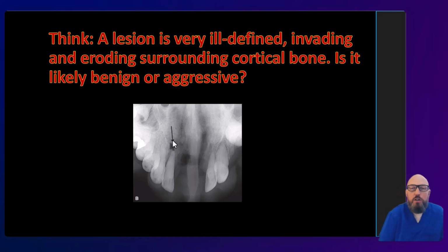And so that covers our size, our shape, and internal structure. And then the last part, we're going to cover the O of lesions, other category. And that's the effect on surrounding structures. It's the letter experienced dentists most often forget. And so then we'll put it all together with a Mad Lib, if you remember what those are.